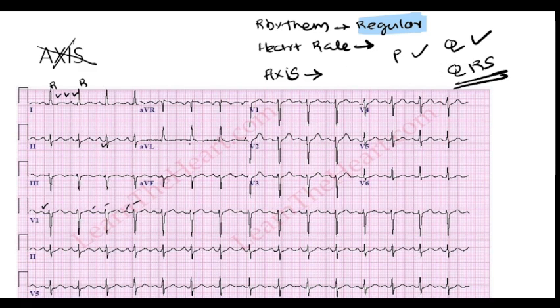Look at the ST segment. Here the ST segment is normal. Can you see here, this ST segment is almost normal here. So ST segment is normal.